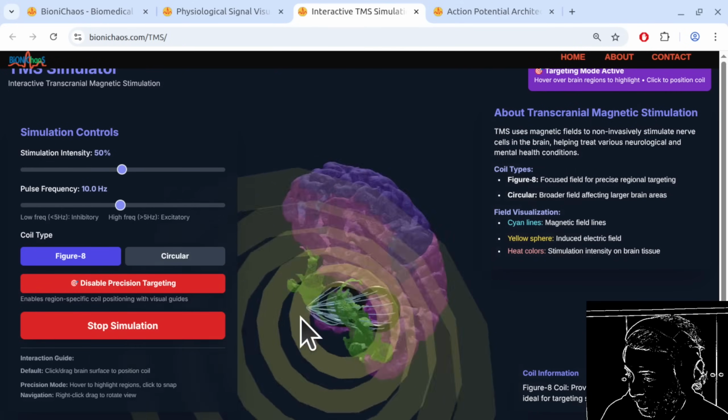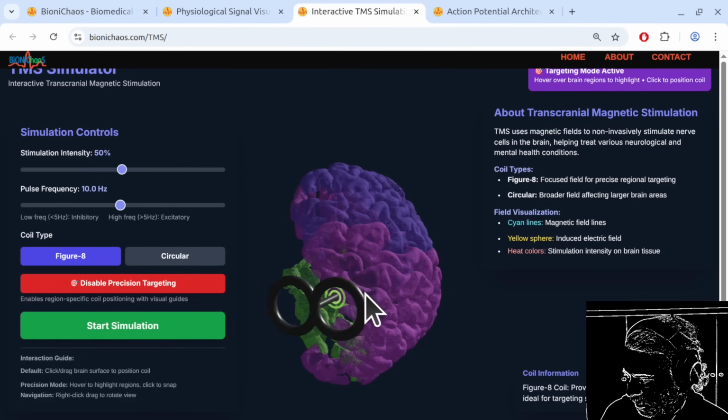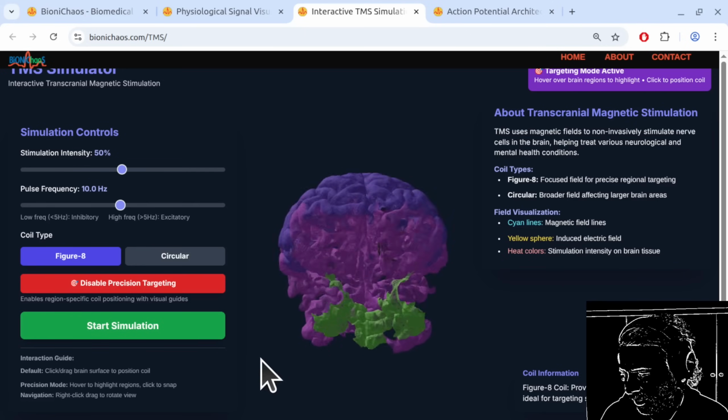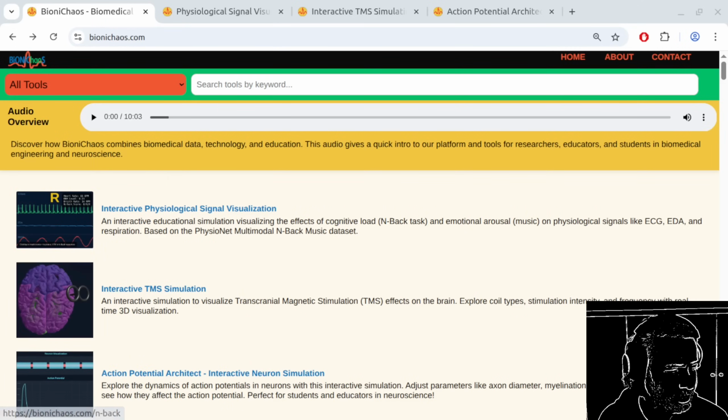Here we're only loading, as you can tell, there are missing things inside it. That's because we're not loading all the brain parts, only some of them, just to reduce the load. Anyway, everything we do appears on this side.